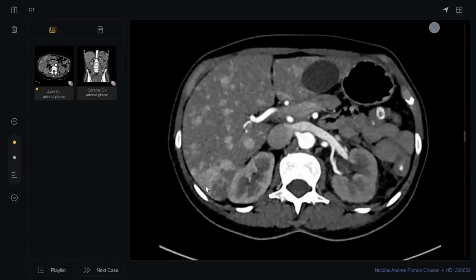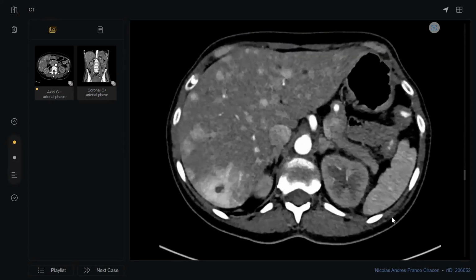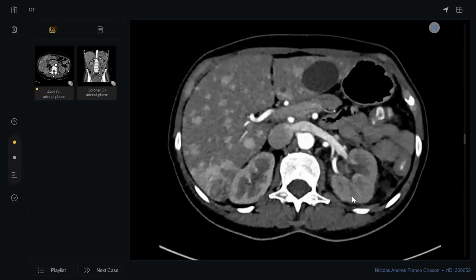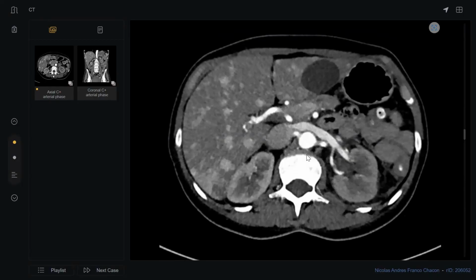I brought it for this. The patient, and I told you from the beginning, if you look here, there is a procedure here. I told you the patient did a procedure. At least look here. When you didn't know, I stopped you here. The renal vein in an arterial phase, so there is a fistula. The main target of this case is to detect this renal arteriovenous fistula after a biopsy. Thank you, doctor, so much. Next candidate. Thank you.